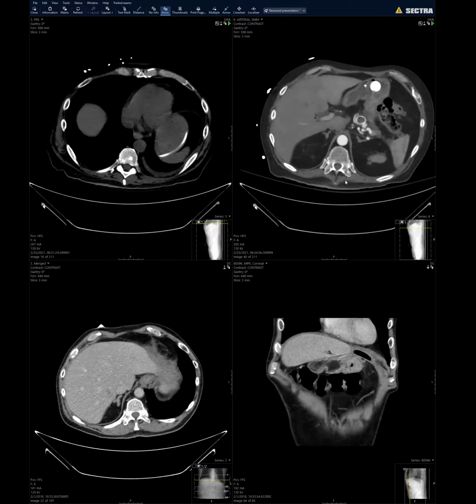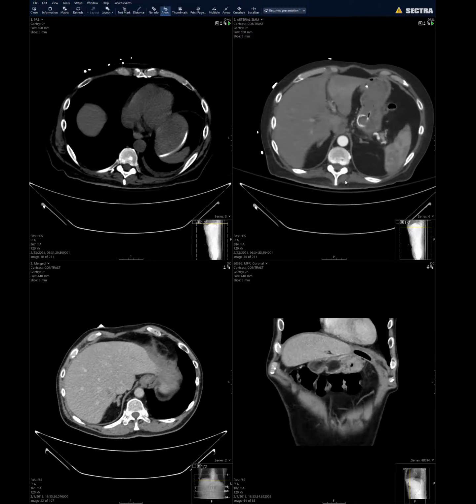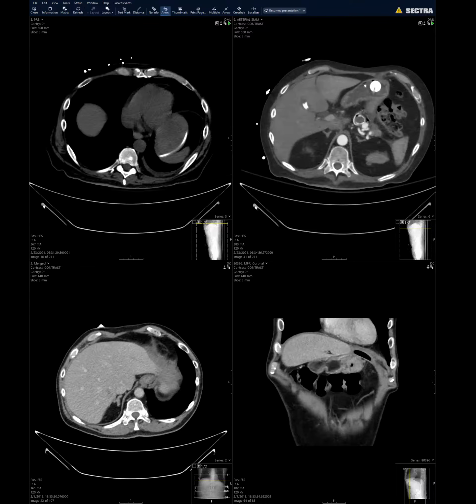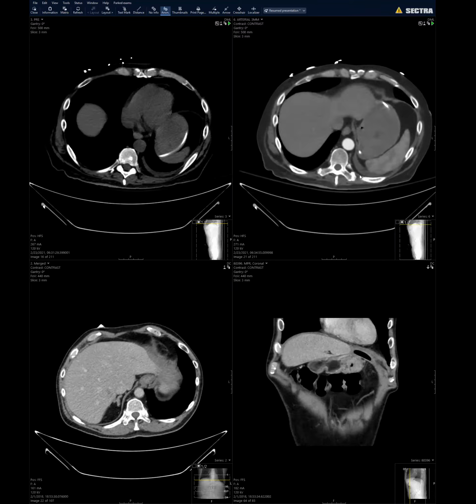And then when you look at post-contrast, I'm just scrolling through the relevant images. There's a splenic artery pseudoaneurysm or something like that next to this gastrostomy. Right, so that's a pseudoaneurysm which had formed off of the splenic artery, and that was what was bleeding into this. Unfortunately, this patient actually died.